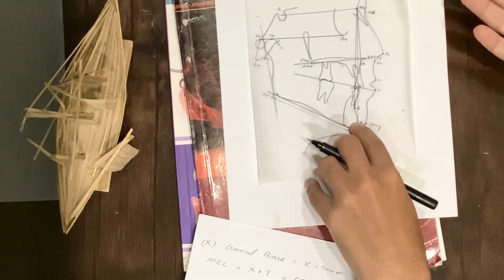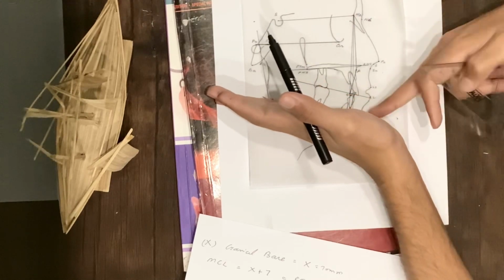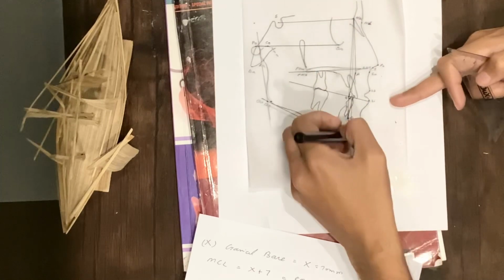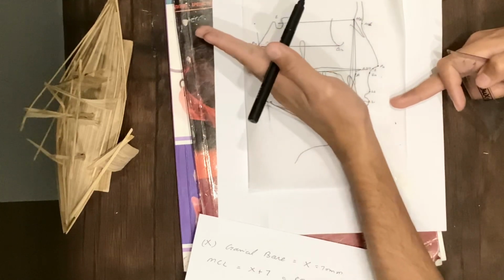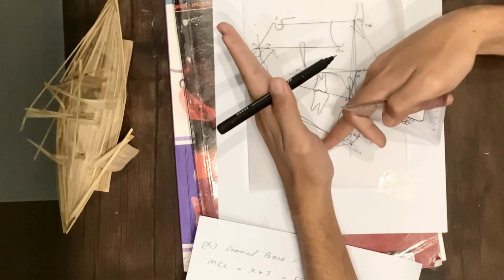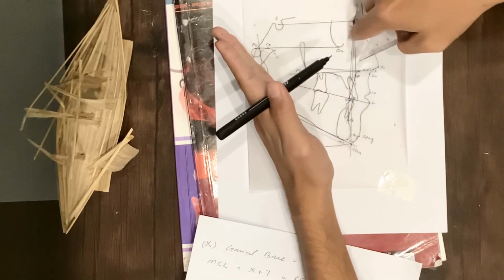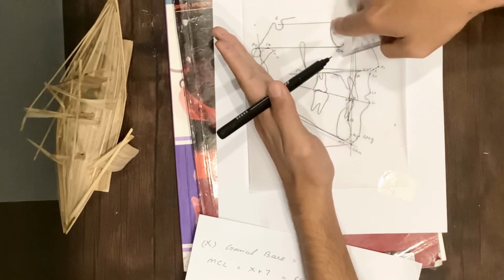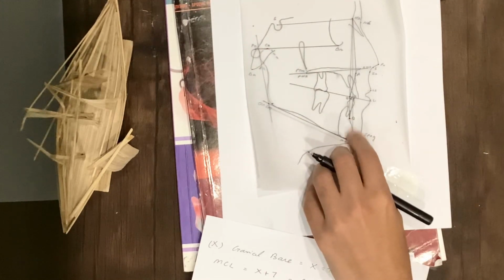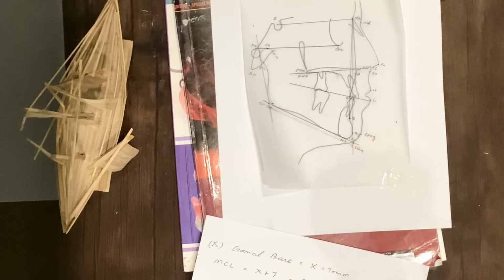So in low angle cases, in which the mandible is more forward rotated, the chin is mostly more projecting, and thus the facial angle will be greater than its normal value. In high angle cases, in which the mandible is more backward rotated, the SN POG angle will be much lesser. So this angle will become acute, lesser in value. So this will tell us about the projection of the chin. So this is called the facial angle value.